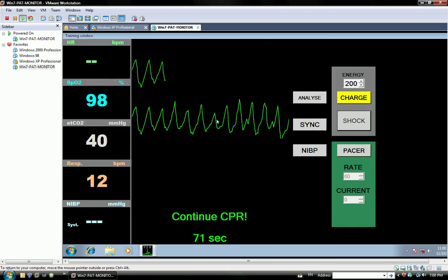Then you will see this wavy pattern, and it's giving you a maximum of about 121 or 110 seconds. Then you can see it's counting to 50 seconds. Then it will continue to count down until it reaches 0.